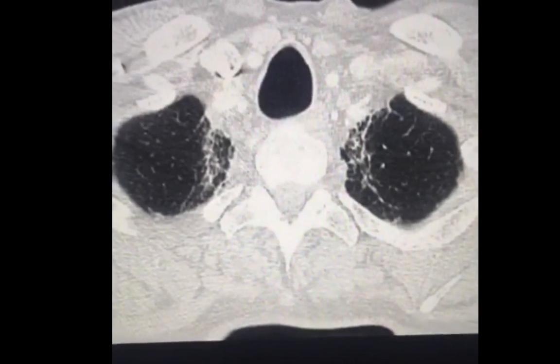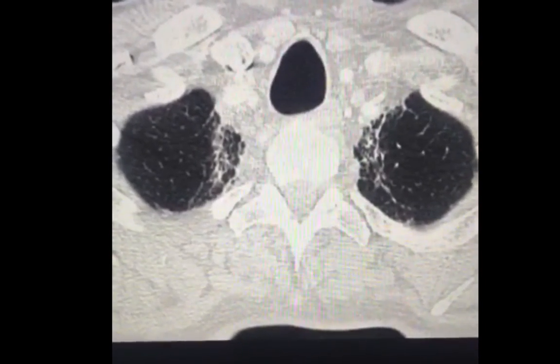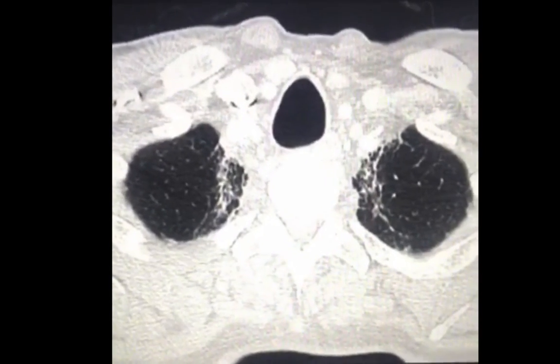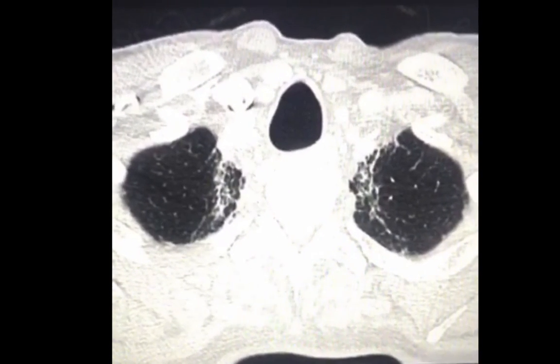This unique appearance is consistent with radiation fibrosis, where the radiation changes are defined by the port in which it was administered. This patient actually received radiation to the neck for metastatic lymph nodes from a primary gastric carcinoma. The teaching point is, when you see fibrosis that is confined by what looks like a port in a non-anatomical location, think about radiation changes.